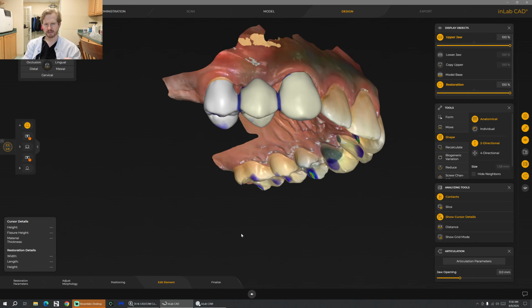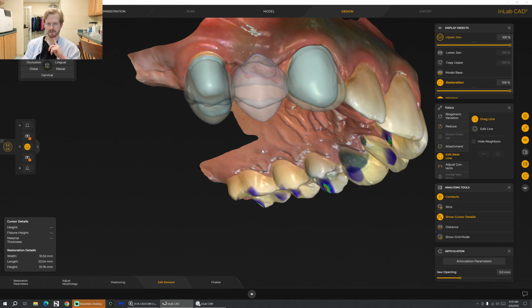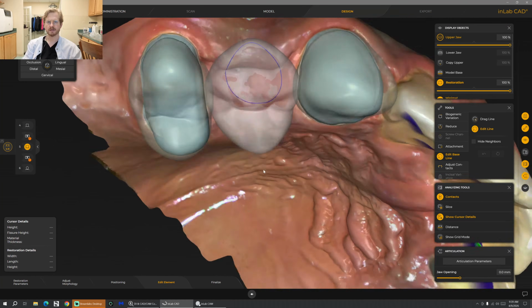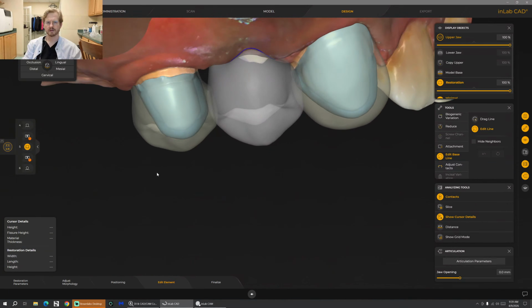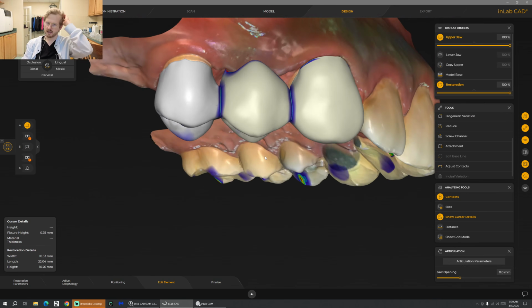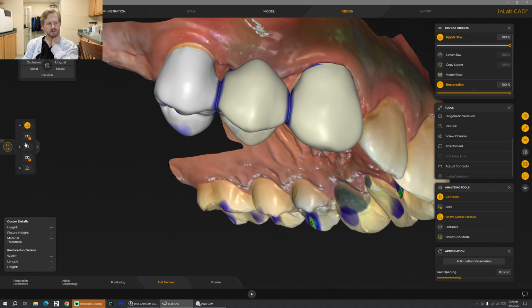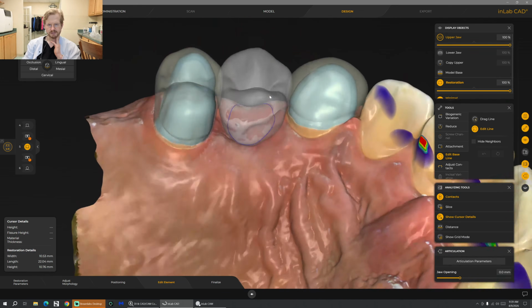All right. So that looks good. We do need to change our Pontic. So we're going to edit the baseline of our Pontic. And let's make this more of a, so I think the inside's probably fine. Let's see, I may not change it. Let's see. Actually, not bad. Let's go back to editing our baseline. Do we want to change this any?